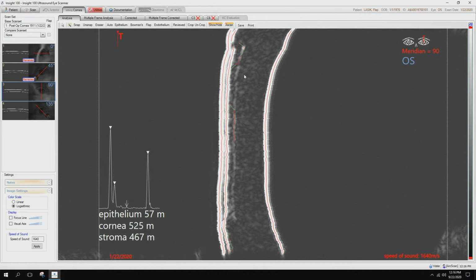Here you can see the flap is back here, but the ultrasound didn't quite pick up the flap in those areas. So there are some tools across the top. Right here is an automatic pickup. If I click on that, bring my mouse back over here, I'm on the left mouse button, I click, hold it down, and now I can correct exactly where that flap is. You want to take your time doing this, because this work will indeed affect the outcomes.